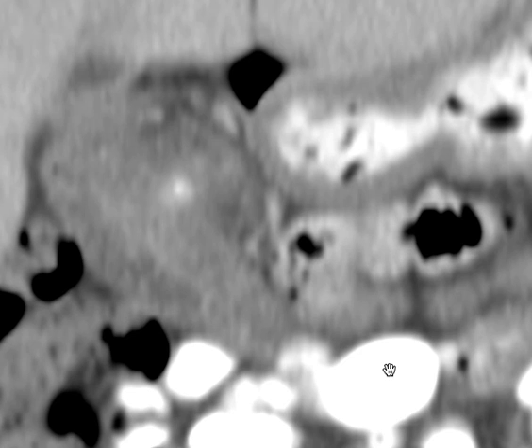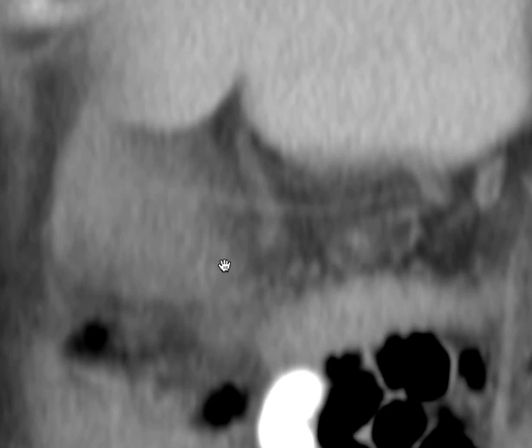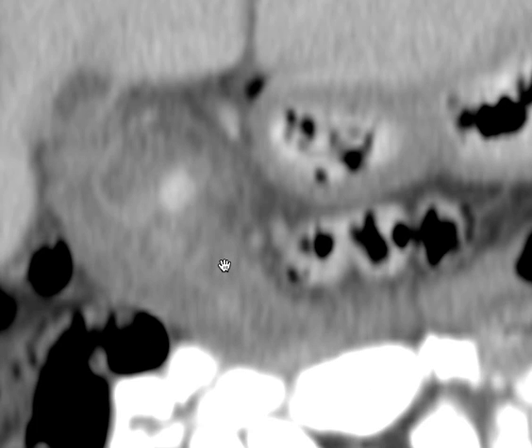So oral contrast is vital to define what is bowel, so that abnormal bowel like this becomes far more conspicuous, and things that are of abnormal soft tissue, masses, lymph nodes, and fluid-containing structures that are not bowel, they all become more clearly identifiable. So this is diverticulitis of the proximal transverse colon.